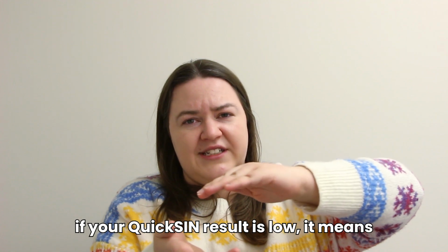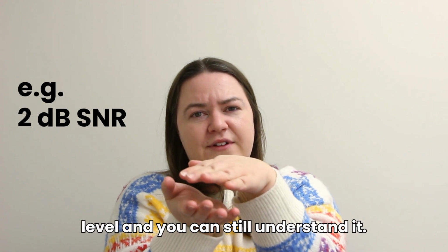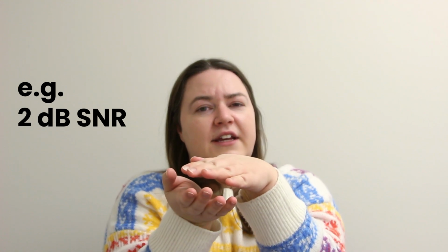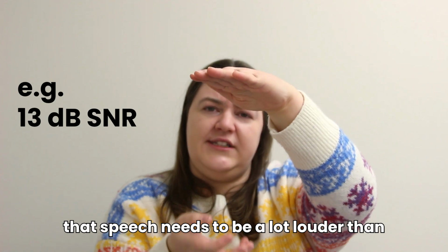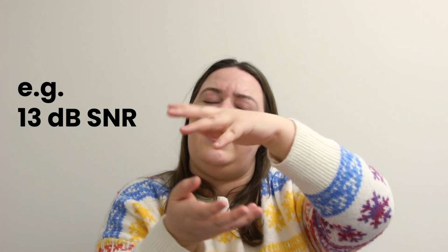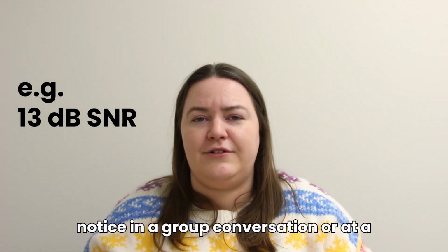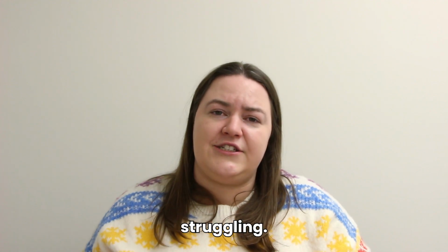So if your QuickSIN result is low, it means that speech and noise can be at a similar level and you can still understand it. If your QuickSIN result is high, it means that speech needs to be a lot louder than the background for you to understand it. And you'll notice this day to day. You'll notice in a group conversation or at a restaurant that you're really struggling.